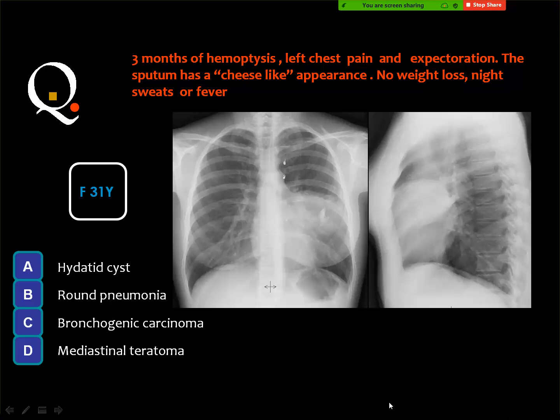Teratoma. How do you know that this is teratoma? Bilateral, maybe. Bronchogenic carcinoma. Okay, according to the history, bronchogenic carcinoma is excluded, and the presence of calcium makes you highly suspect a teratoma in the mediastinal mass. But bronchogenic carcinoma can calcify, you know?